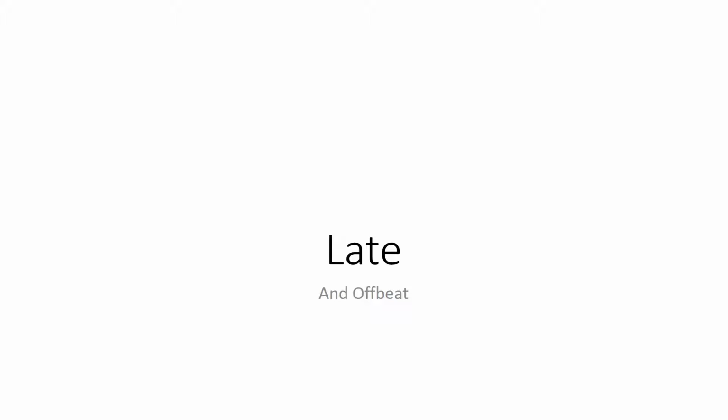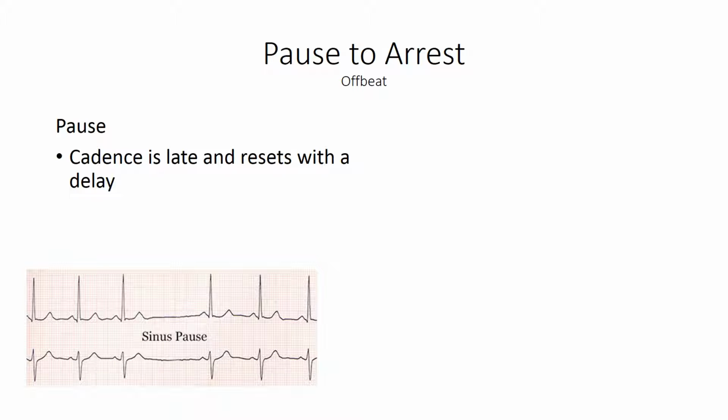Late and offbeat. That would be your pause. If you look at the EKG at the bottom, the beat should occur here, however, it missed the beat. And when it did reset the cadence, it set it at a delay, so it does not match the previous beat.